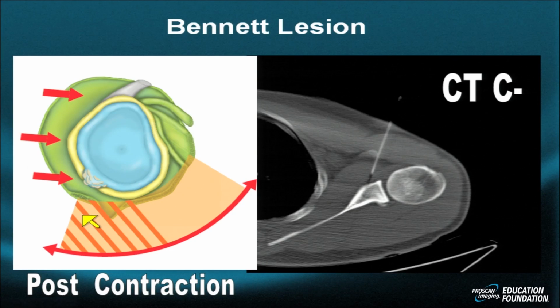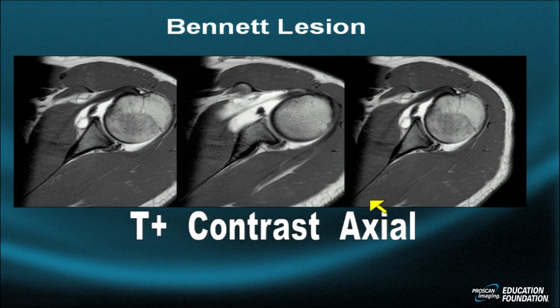Here's the traction in the sagittal projection of the posterior inferior glenohumeral ligament band on this area, the green representing the capsule, the yellow representing the labrum and glenoid edge, and the blue representing the hyaline cartilage. Over time, ossification occurs around the posterior aspect of the glenoid due to this traction, seen as a curvilinear area of high density on this axial non-contrast CT. The Bennett lesion may be very challenging to assess and diagnose on MRI.